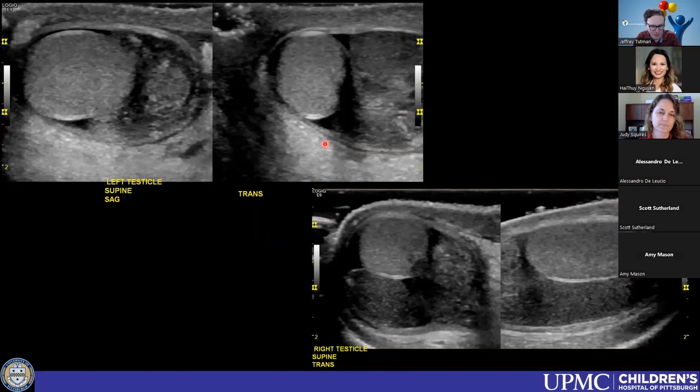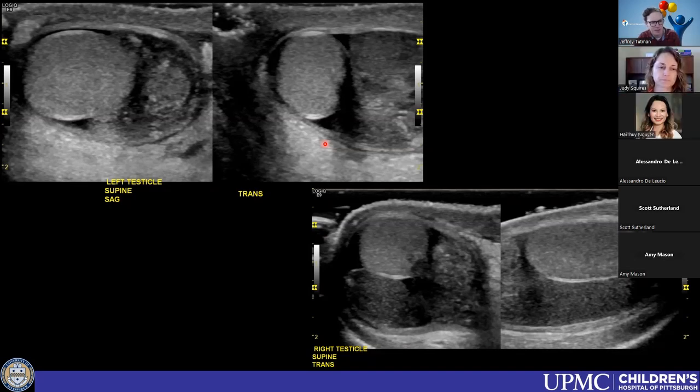If all we had was the imaging appearance that I'm showing you here, and we did not have any of that additional history, I think it'd probably be a more difficult diagnosis to make for sure. But just be aware that HSP can have scrotal involvement. So typically we'll have scrotal thickening, epididymal thickening, and then can have a little hydrocele like is present in this case.